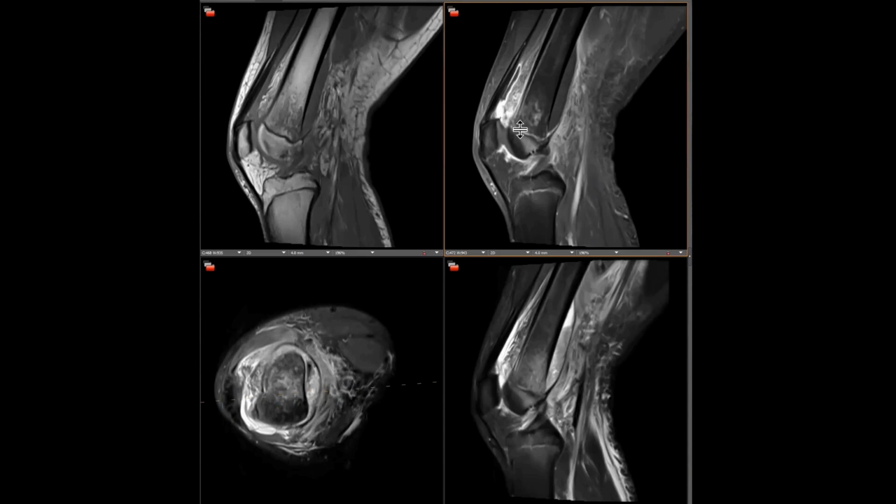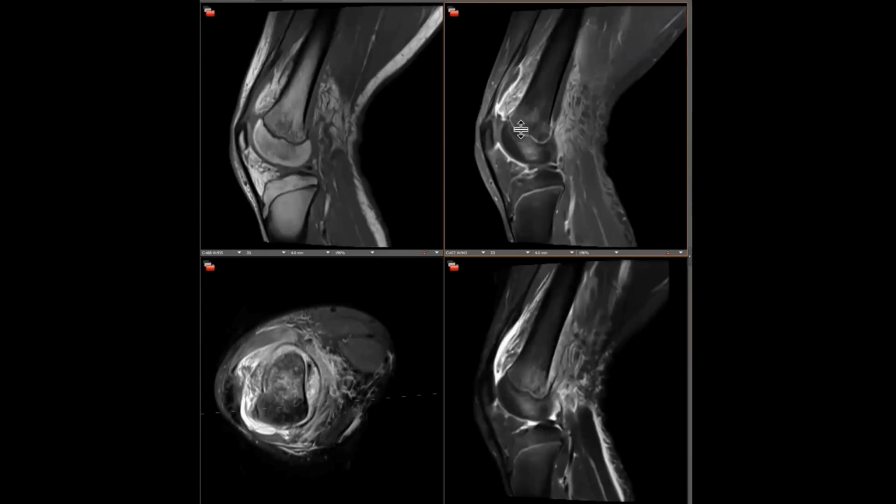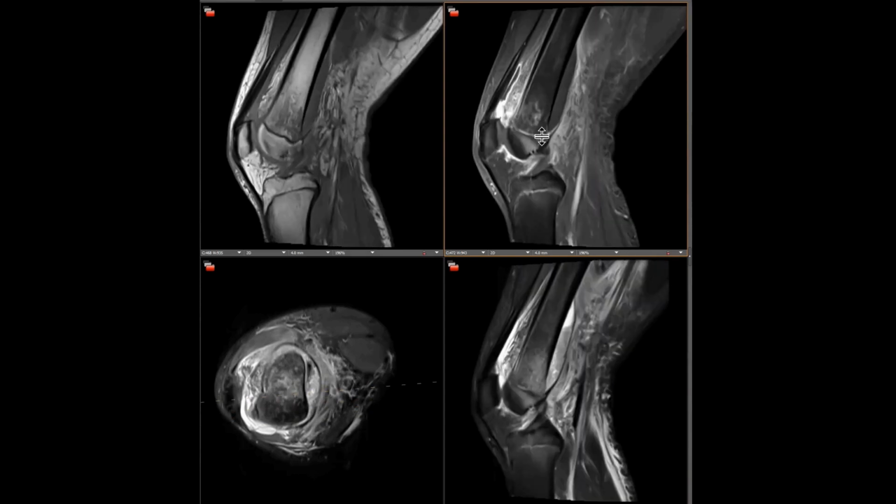In these cases of osteomyelitis, be it in the diabetic foot, next to a pressure ulcer, or in the metaphysis of pediatric patients, we should assess the degree of enhancement in the involved bone. We expect marrow enhancement with osteomyelitis. Decreased marrow enhancement may indicate impaired vascularity, which would decrease delivery of oral or intravenous antibiotics.